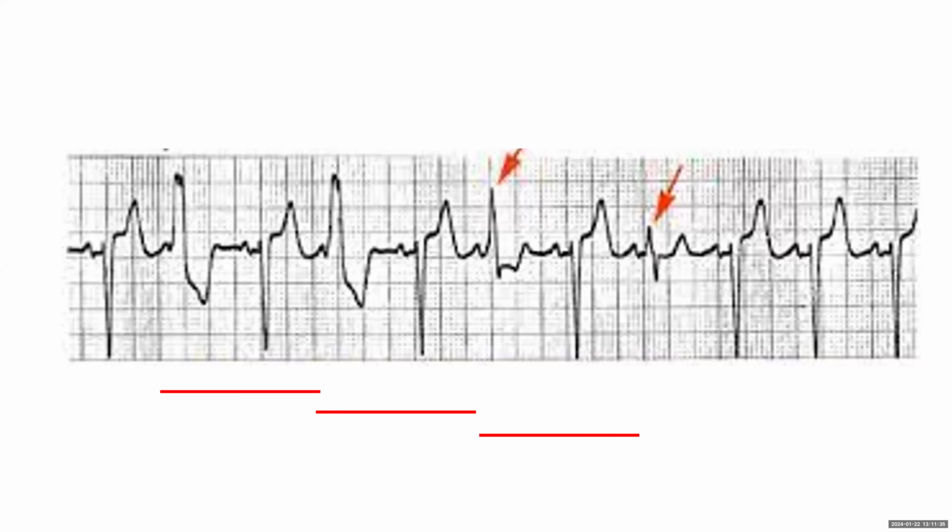Parasystole, excellent. Yeah, parasystole. So what's parasystole? Ventricular parasystole, what does it mean? PVCs in regular interval. Yeah, means that the PVCs are essentially independent, dissociated from the underlying rhythm.